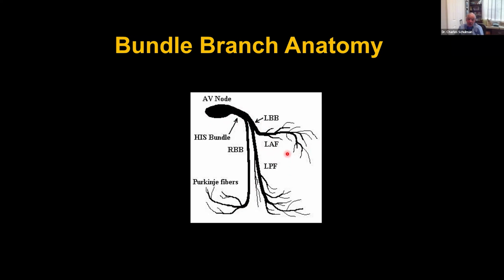This shows the anterior on top of the posterior, but actually they are oriented like this in the chest. So when you try to draw a flat diagram, you don't really appreciate the actual location.